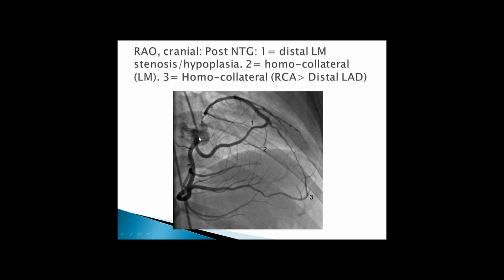Cineangiograms of a single ostium of the right sinus of Valsalva with a large right coronary artery, a large left main trunk going epicardially in front of the right ventricular outflow tract that would be here. The left anterior descending starts at this point and is fairly small distally.